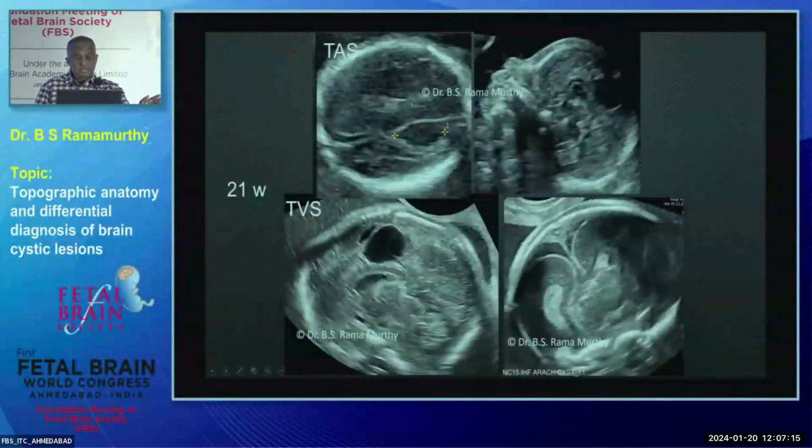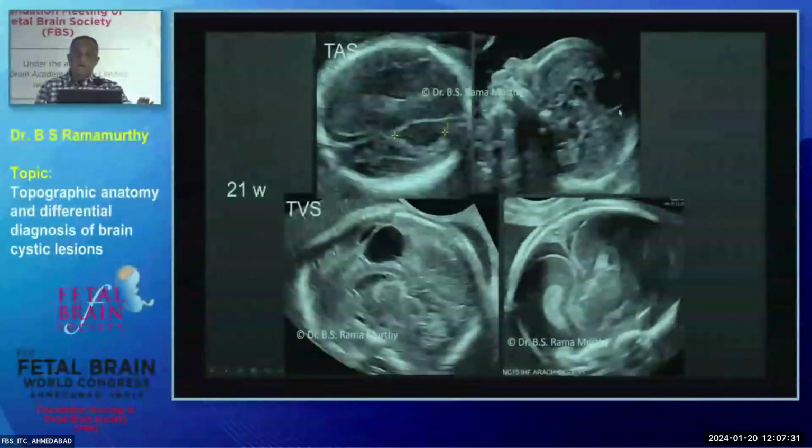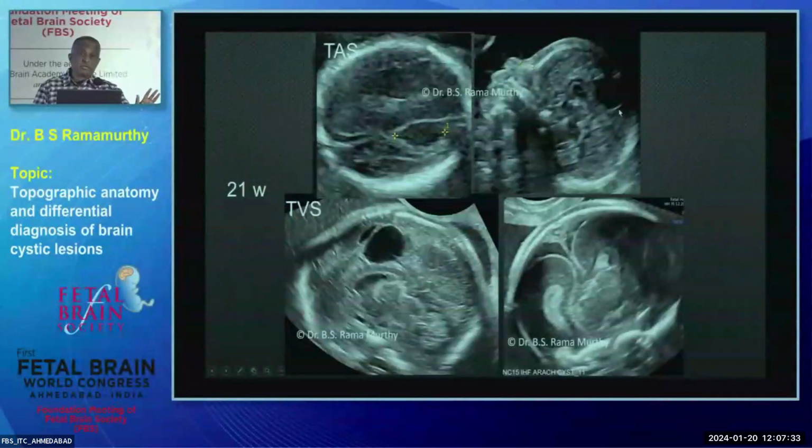Okay, now let's look at this. Again, extraaxial, supratentorial, midline, parafalcine. Yes, this is midline, mid-sagittal section on the abdominal approach. You know you're seeing the corpus callosum. You know you're seeing the cyst there, but how confident are you about the corpus callosum? Now you want to know whether the corpus callosum is there and intact or whether it is partially present, isn't it? So how confident are you in saying, yes, it's intact? Not really. So go vaginal.